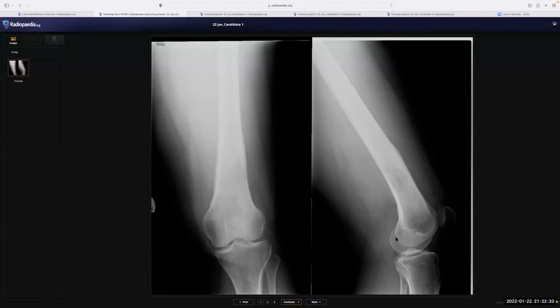So to take this further, I need correlation with previous X-rays if available. If this is the first presentation, then I need to communicate the findings to the referring clinician, and probably my differential may include infection like osteomyelitis, or an aggressive osteosarcoma can be a possibility.